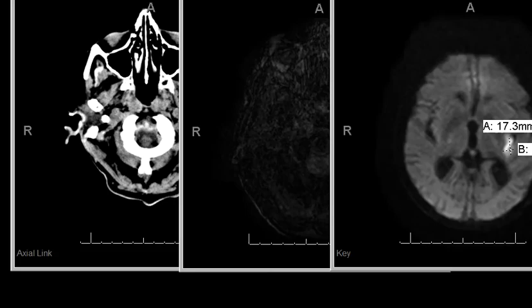Other cases are either tumor mimics or so far just show you that this is a snapshot. We did not really select any cases to present. This is our experience from March 7th to April 11th, 2018. Now moving on to some other interesting cases.